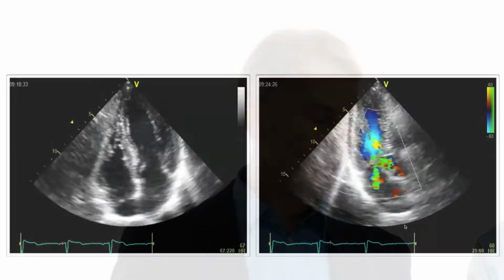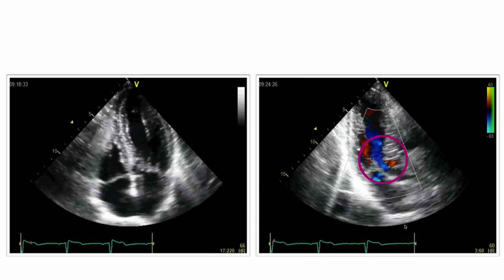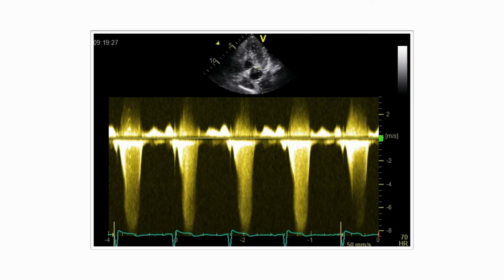Look at the four-chamber view here on the left and also at the color Doppler study on the right, where we have flow acceleration right at the point where the mitral valve is actually touching the septum. There's also some degree of mitral regurgitation. So this is a phenomenon you will see very frequently in patients who have hypertrophy to start out with and who then also have hypovolemia. And it is also a situation that, as you well know, in cardiovascular surgery is something you have to be aware of. Yeah, of course. It can make things even worse because it causes flow obstruction and hypotension.